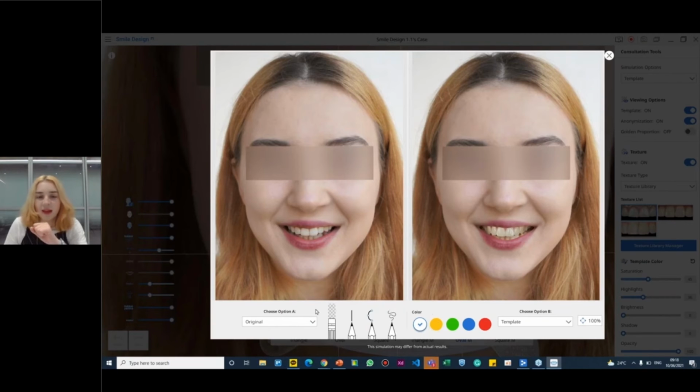Yeah, and so here in a preview we have these quick options to draw something or delete something, and I think one really cool thing that we introduced with the last update as well is that all the treatment simulation options that we created, you can compare among them. So, for example, if I want to compare metal braces and ceramic braces, you can show your patient, okay, this is how you look like with both, maybe which one you like better. I think it's a great communication tool.